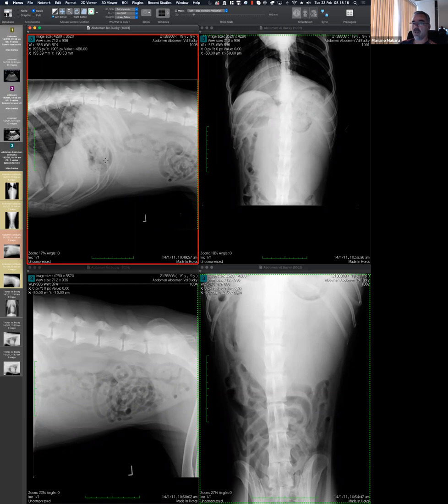Probably the other thing that I would add is that, well, in this case, someone could be thinking about the left kidney, and we already mentioned that we can see the left kidney seems to be in the right place, seems to be not displaced, so it's less likely. Any other considerations in terms of structures? Which anatomical structure, if it turns very big, could result in this appearance?